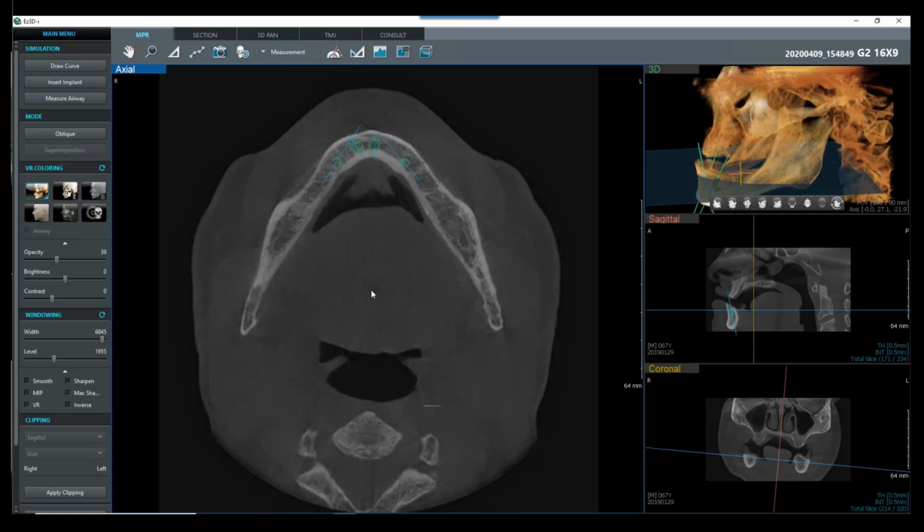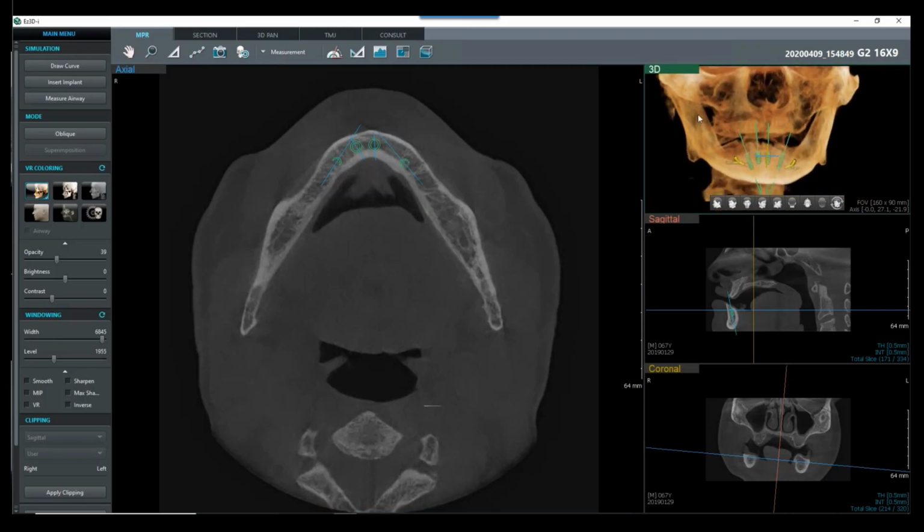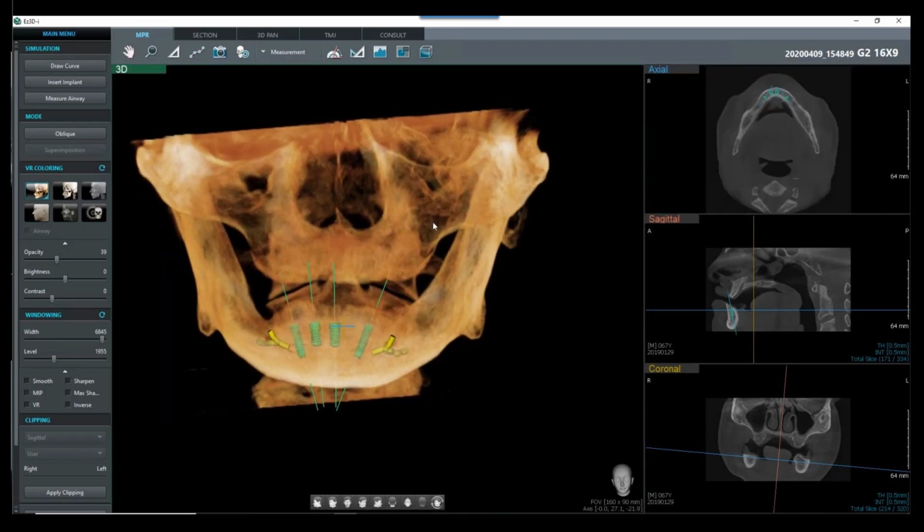What type of prosthesis are we placing on here? What materials? So we really need to keep all that in mind. That's where we will talk about using our labs or our prosthodontists on that. But we can do a right click here, switch to main view, and we can see our case plan.